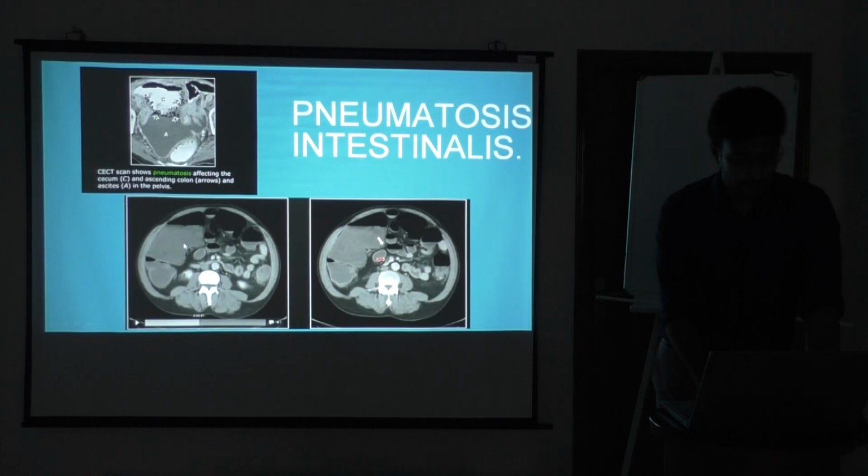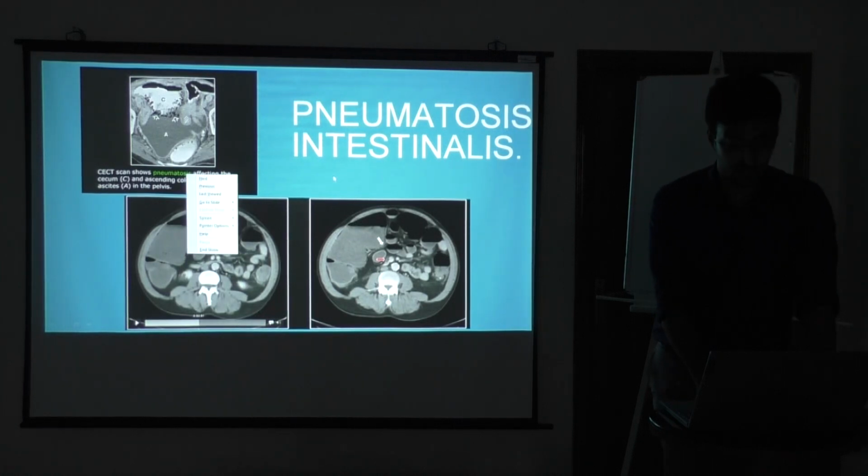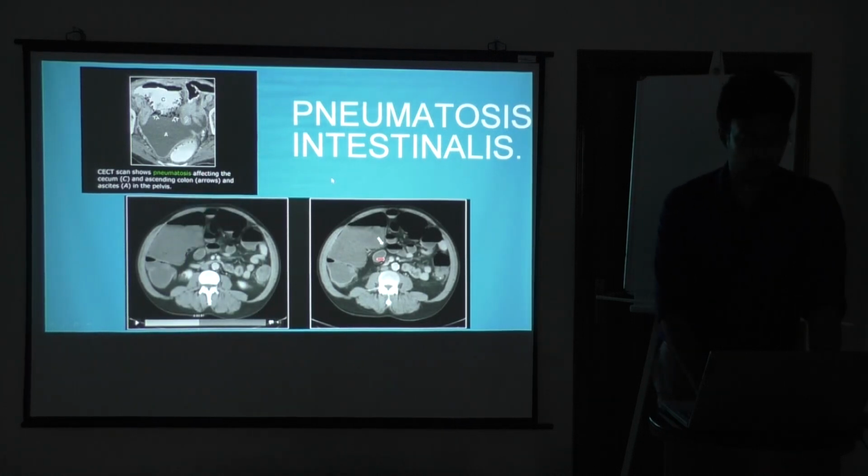Here you can see this is large bowel. You can see the gas is there within the lumen, but it is nicely staying afloat. But you can see in here along the wall in the edges. So this is a typical sign of ischemic bowel. So there is something compromised in the blood supply, maybe because of the venous ischemia or venous thrombus or whatever it is. Cause doesn't matter as long as you can pick up something is very wrong.